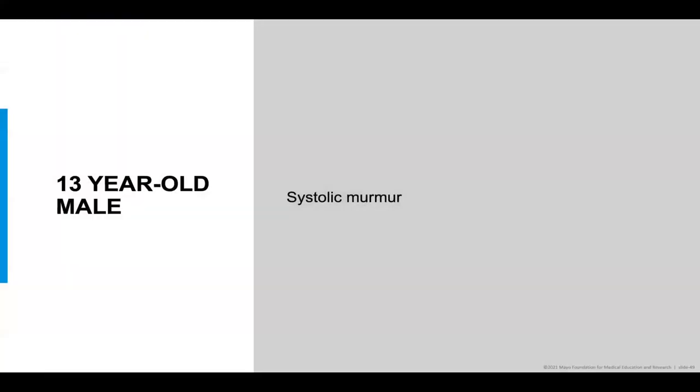Yeah, thank you. Now in this case, it's severe aliasing because I needed a case that showed it, and so I purposely set the VENC super low, much lower than I should, and so the entire flow in the valve was aliased. They would probably show you one that had a few pixels of aliasing in the center.